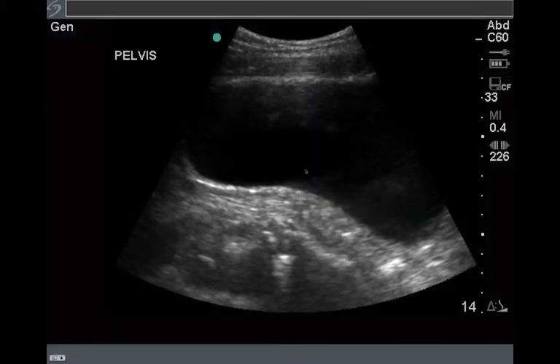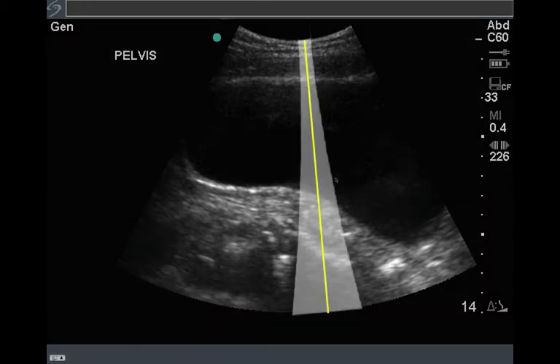So if we look at this picture of the bladder, it looks like there's something in the back of it, that maybe this is sediment that's actually gathered in the base of the bladder. But when we think about it, the ultrasound beam is a single beam that comes down. In reality, it's wide. The ultrasound machine thinks it's thin. The edge of the ultrasound beam hits the bladder here and gives some reflection back.